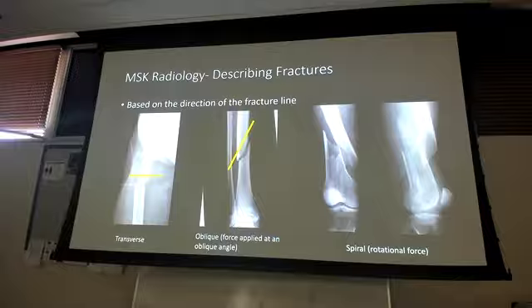When I'm looking at the hip and the pelvis area, in my mind's eye, if I continue to draw this, let's say this was a puzzle, and you had put together this piece of the puzzle, and you started to get more pelvis pieces. Based off of the direction this is, and looking at the soft tissue air, my pelvis pieces are all going to go all over here. So now I can imagine another leg being here and the rest of the pelvis.